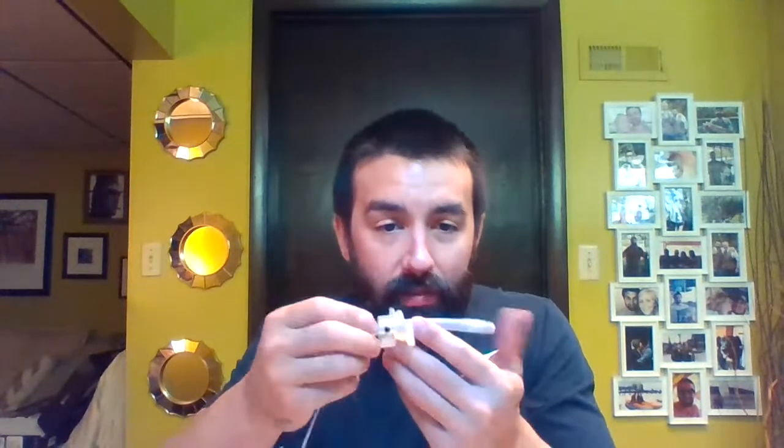So a lot of times you'll see these trachs get placed wrong in people, or they don't confirm it with a bronchoscopy, and sometimes that thing can be sitting up against the wall of the trachea. I have had problems, and we'll address that as we get into some airway troubleshooting. But if this thing is not properly placed, you can end up in the back wall of the trachea, or it could be curled back and around. So it should hopefully be adjusted through bronchoscopy where it's sitting in the middle of that patient's trachea. Once we get a depth that works, once again, it should be confirmed via bronchoscopy.